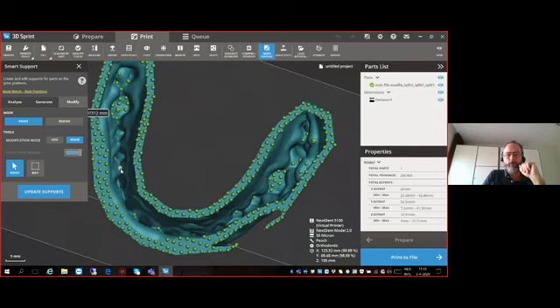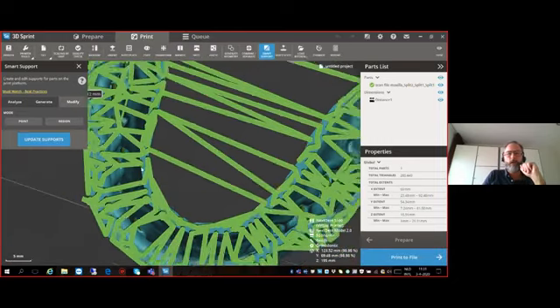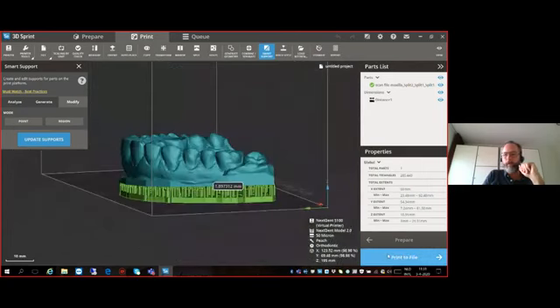Supports are there for a reason. So I'd rather have you move supports rather than erase supports. And again, adding is no problem. If you have changed something here in the supports, please make sure to update the supports, and then everything you changed is now updated. And again, the print, you can send the model and supports to the printer.